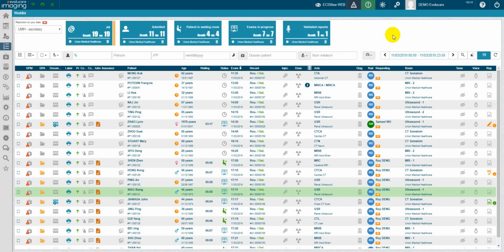For that, I'm gonna show you two examples. One example is the widget that has been designed, for instance, in the case of secretaries, for what they need to see. And I will then also show you how that looks, for instance, for a radiologist, right?